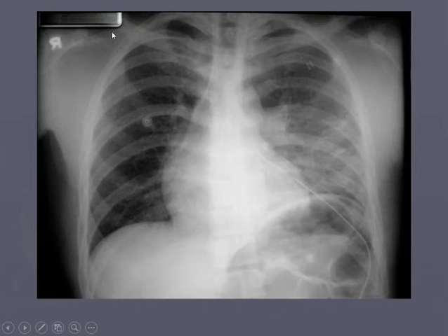E, everything else. All right, so we have our marker. What's this? What's that radiopaque line? That, my friends, is a chest tube. Something's not right. And then F for fields. We have a bit more hazy density there, maybe a little atelectatic. Maybe a pneumonia, can't really tell.